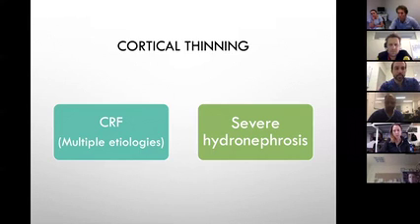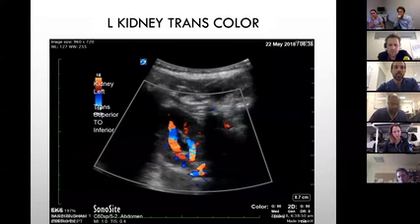Just one question about the color Doppler with renal ultrasound. The scale on the image that you showed before was around 18, I think, for the color scale. Is that typical of what you should be using? You can see that it's a lot of aliasing there. Yeah. Can you see that? So technically, you could have probably gone up in your scale a bit. Okay, but that's around the ballpark, and then you adjust it for the image.